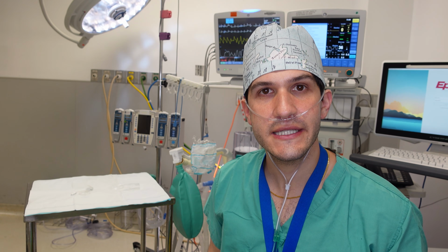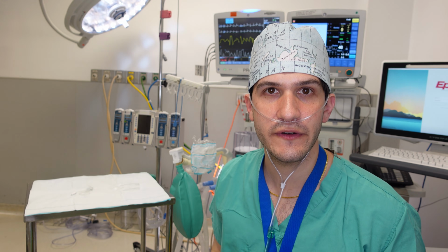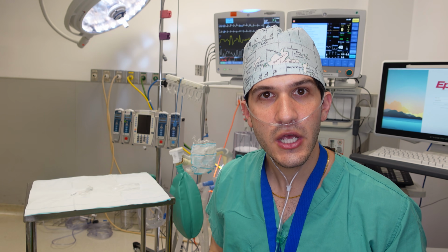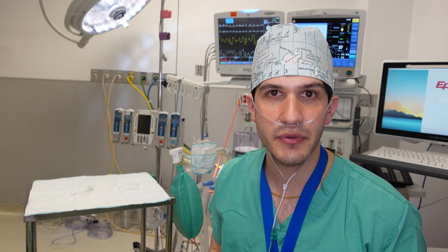Last but certainly not least is connecting a thermometer to a patient. And the thermometer not only tells us that we've made the operating room very cold, but also gives us a sense of what a patient's core body temperature is, which can influence a number of really important physiologic factors like metabolic processes that occur in the blood.